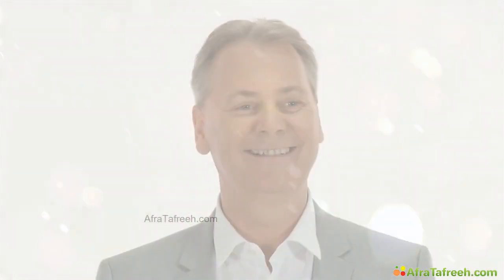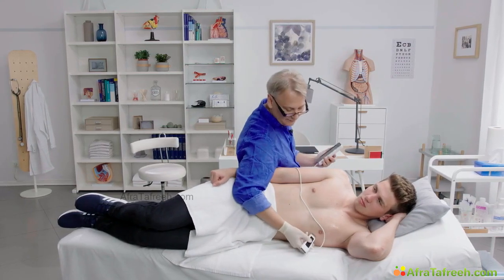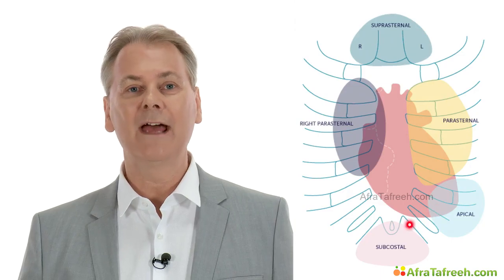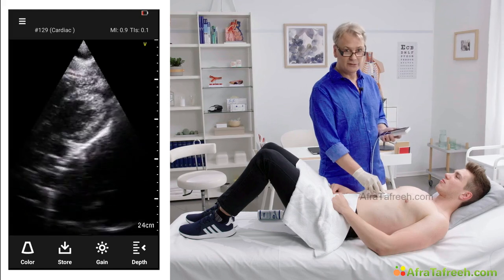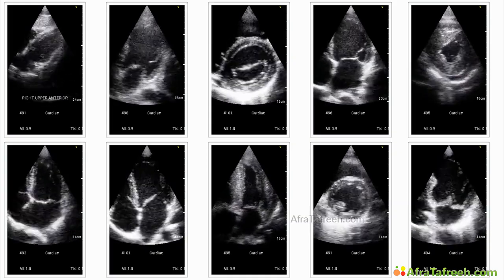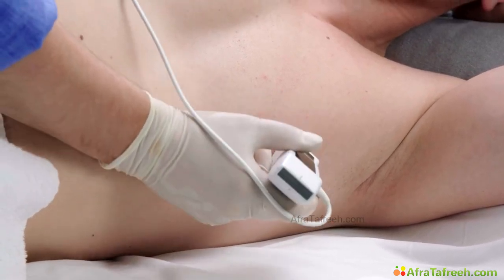In the following lecture, Professor Thomas Binder from the Medical University of Vienna, Department of Cardiology, will explain how ultrasound can be applied in a primary care setting. Here you will learn to image the heart and estimate left ventricular function. In addition, we will show you how to detect a pericardial effusion, another important condition that needs your medical attention.